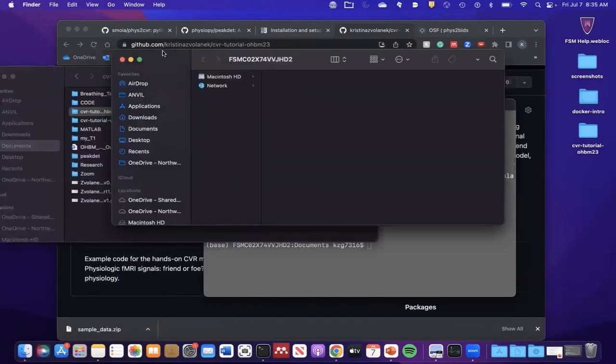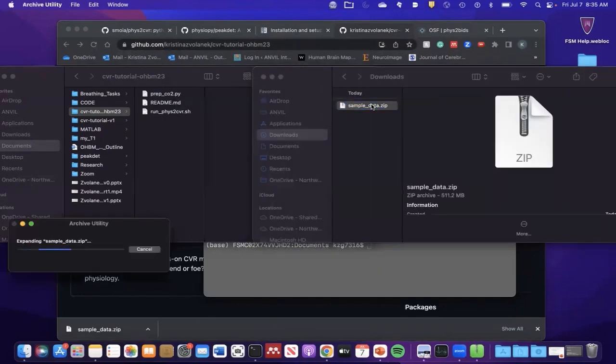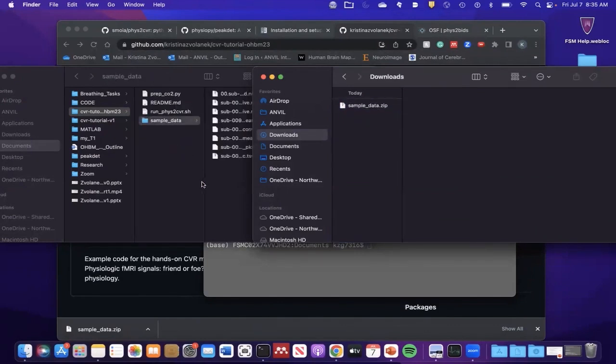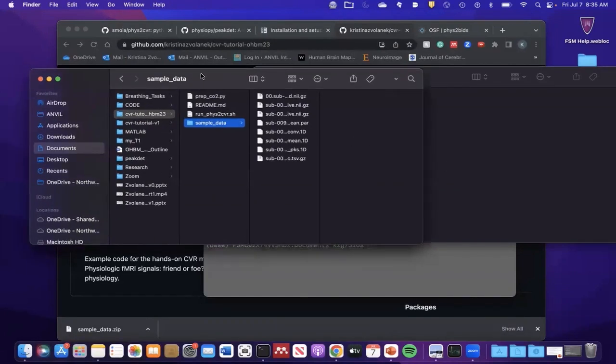So if I open a new terminal window and run Python with IPython, I can just copy and paste these lines one by one and run that there. So in case that works better for you, you can do that, but I will be showing how to do it in Spyder.